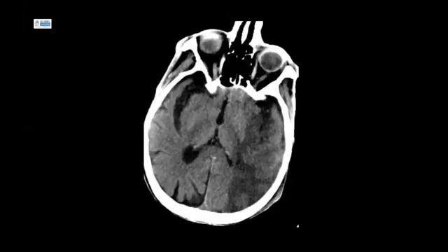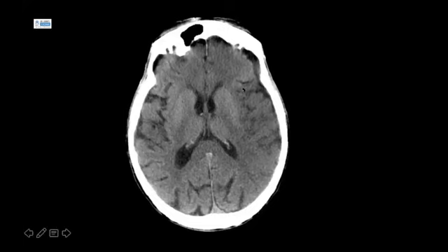And this is the same patient 24 hours later, just to demonstrate how extensive this stroke has now become. So it's very important to review this as an early area of stroke on a CT brain in the appropriate clinical setting. And it's important to change the image to stroke windows, which helps you pick up these findings easier.